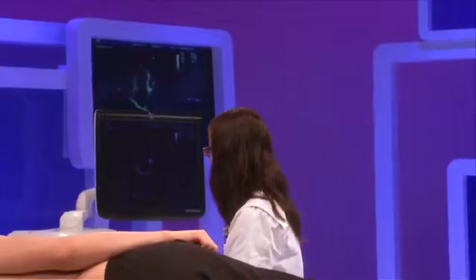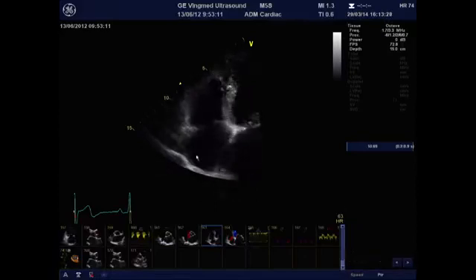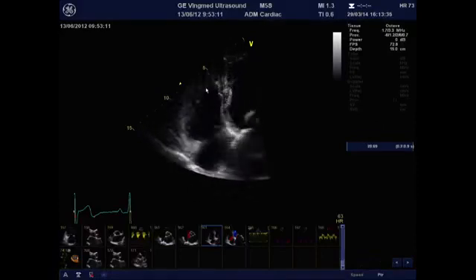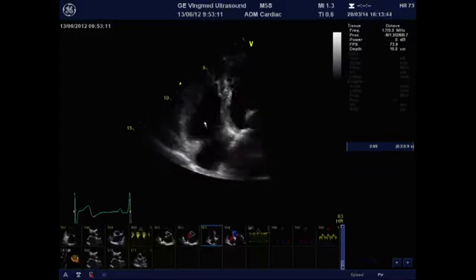And lastly, what you can do is just take a look at the right ventricle, because significant mitral stenosis has repercussions on the left atrium size and on the pulmonary artery pressure, and also on the right atrium and the right ventricle, which are facing overloading pressure, and thus they become dilated, and also regarding the right ventricle hypertrophic, and at the end stages they can become dysfunctional.